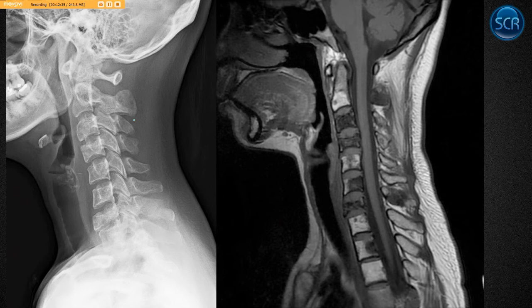This one a bit more subtle on the X-ray. ADI actually is increased in this case, so that's cause for concern. We follow this down. That vertebral body doesn't look normal. It should be flat or even a little bit convex on top. So this one's collapsing. This one's completely collapsed. This is a burst fracture. Pathologically, it looks like they pathologically fractured their spinous process as well.